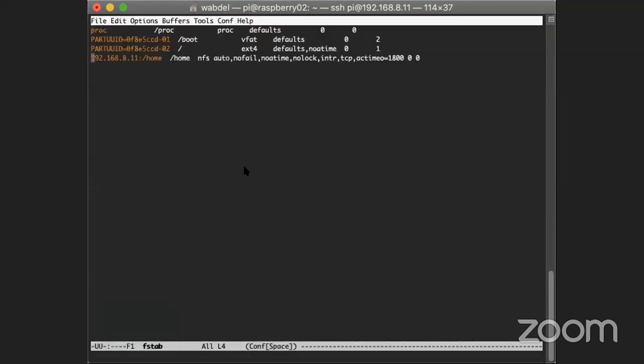So this line here, you're going to change /home. You will put /home/sing/EGS, and here you will put exactly the same thing. Just make sure that on the local folder you have a directory called EGS_home. You need to create that, and then it should work.